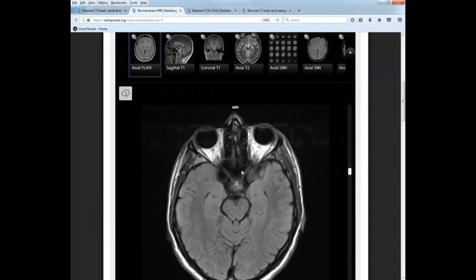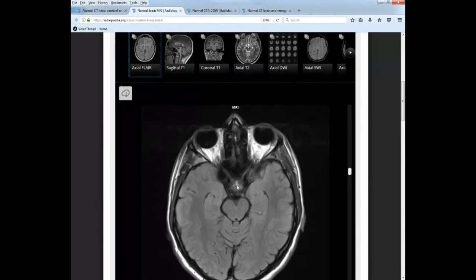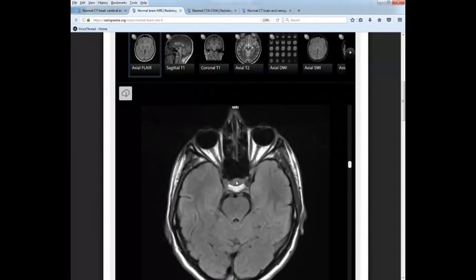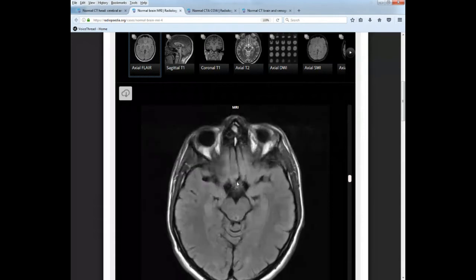So first thing, look for Mickey Mouse. Just anterior to Mickey Mouse, suprasellar cistern. Look at the optic nerves coming down. Suprasellar cistern. So we know in here is the pituitary gland, right there. What's this guy? Dorsum sellae. So the pituitary gland, we know there's a little stalk coming up superiorly that's going to connect to the hypothalamus. We have these Mickey Mouse ears coming up.